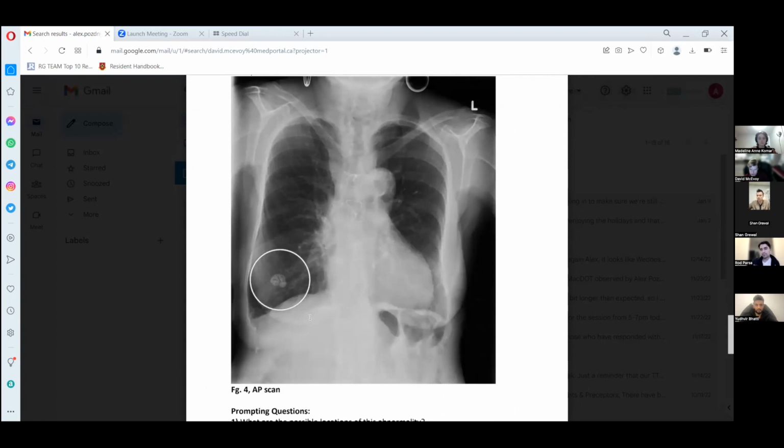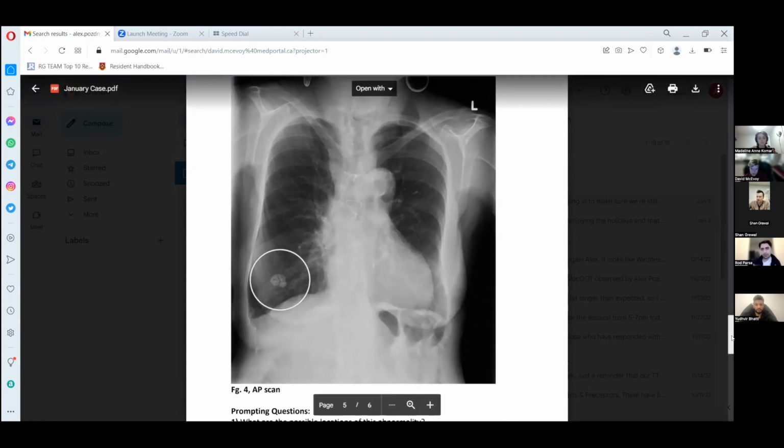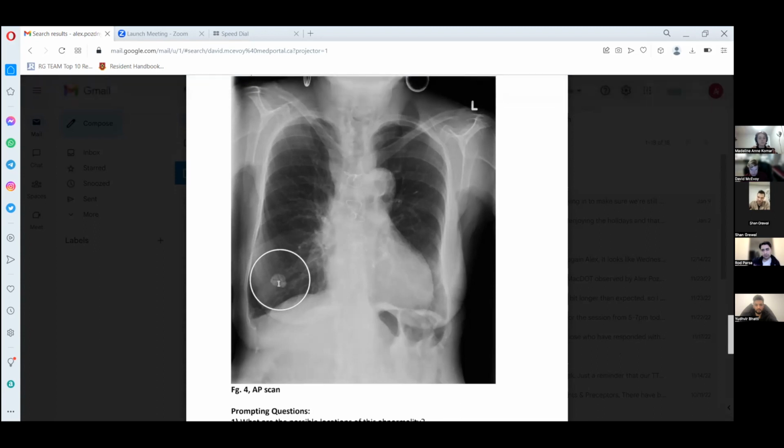That's a good thought, but I would say it's not really that indicative of the location. I think it's just by the nature of the pathology, because as we found out later, this is localized to the breast tissue. Probably this is just what calcified breast tissue looks like, because this looks like some mammary glands.